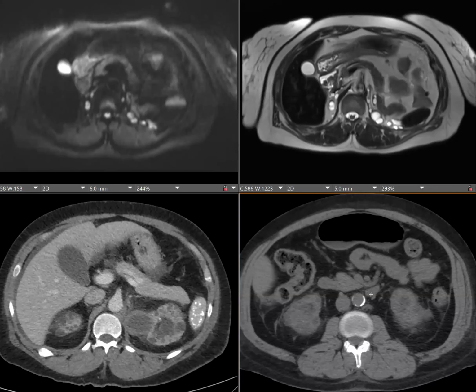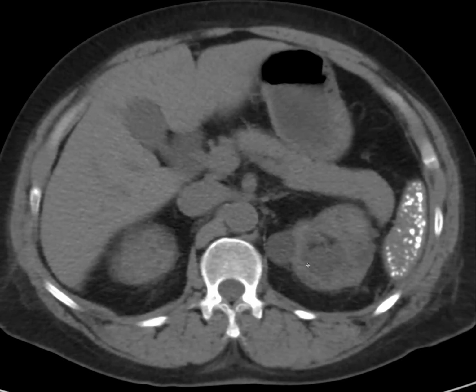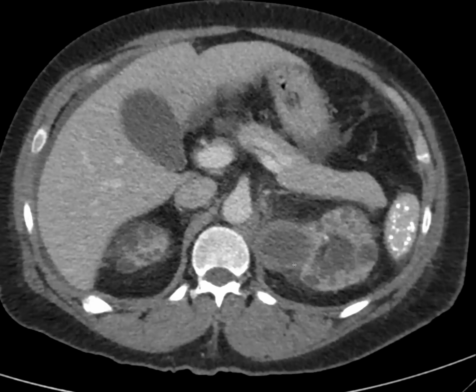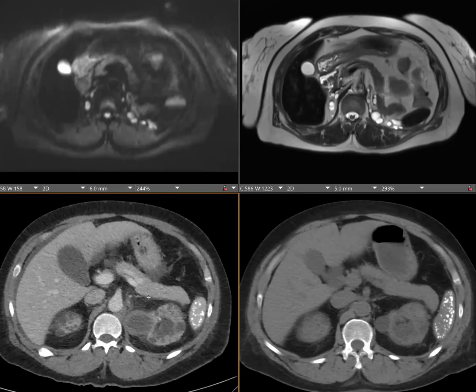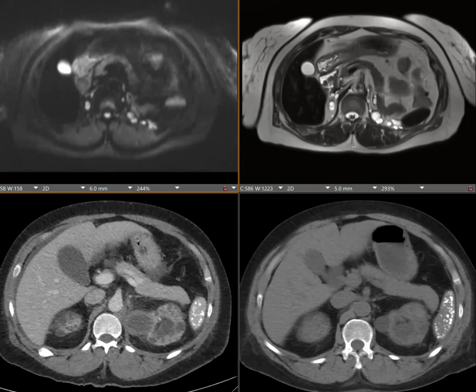So this was a female patient in her 40s. She has CKD. This was like 13 years back or something. She has multiple cystic lesions. This is one of the cysts that I'm showing of interest. The interval between that scan and this one was like 6 months, and it started developing a thick wall and some soft tissue component. So they resected it. It came back as clear cell papillary RCC. And then she was on follow-up. She underwent nephrectomy, and many years later, I think about 9 years later, she had bilateral nephrectomy.